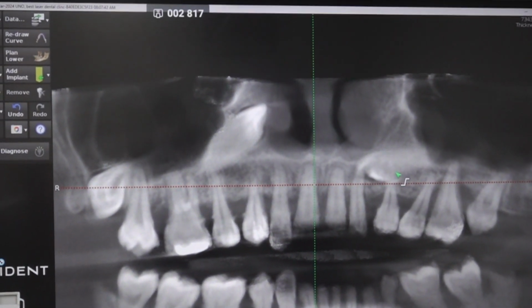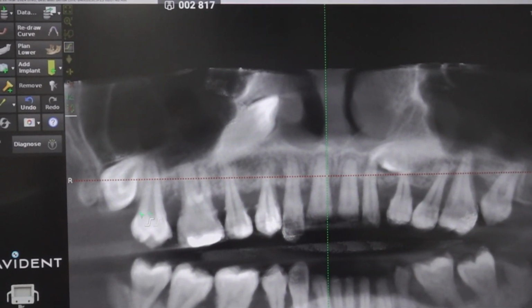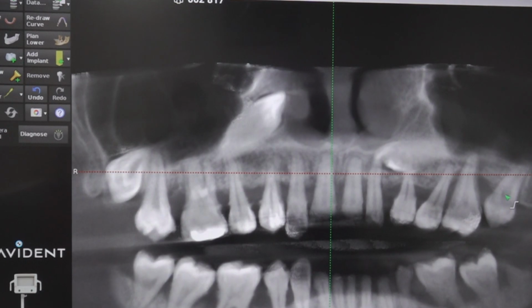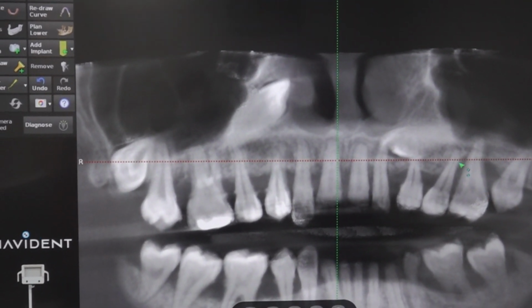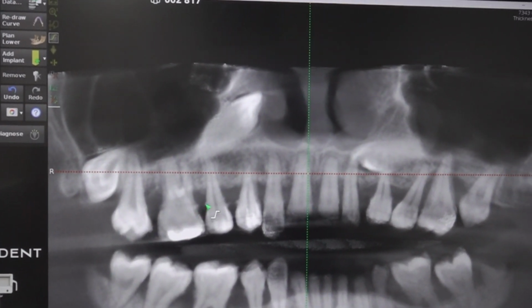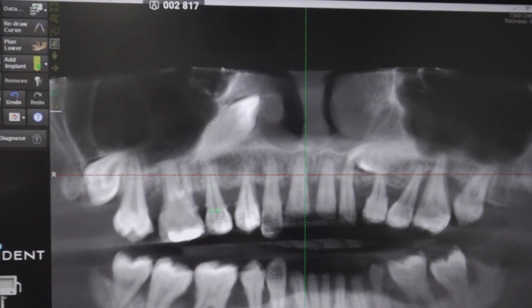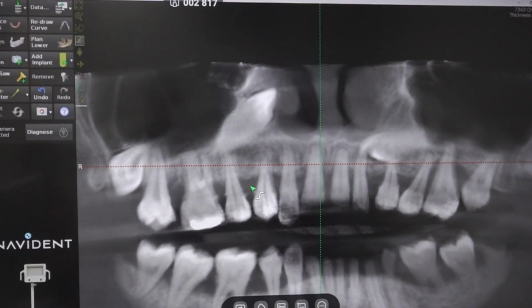Okay. The sinus is clear. 1/8 is impacted. This is 2/8. 2/7 is missing. You can see severe bone loss in 6 till the apex. You can see the interdental calculus also. So patient hygiene also is bad.